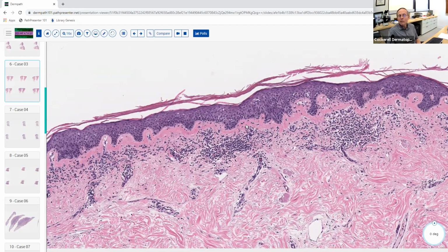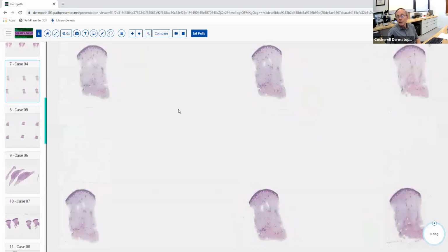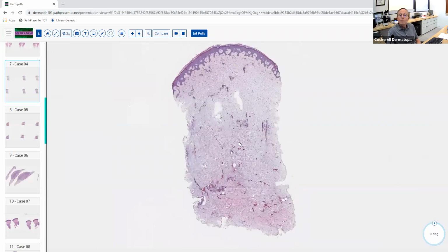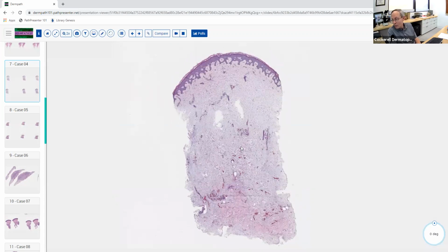The only other thing I would say, the opposite of this pattern, is if you see patients that have Sézary syndrome, they actually get minimal epidermotropism, they kind of lose the epidermotropism, it becomes more leukemic in that stage. You still can get the patchy band-like infiltrate, but you don't get as much epidermotropism, and unfortunately, the hardest diagnosis to make is probably the epidermal changes in Sézary, because they just don't have a lot of epidermotropism. Okay, next one.